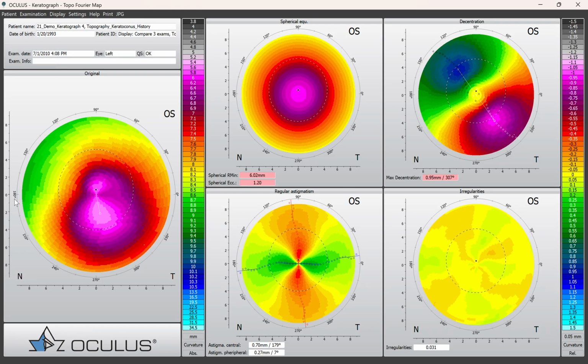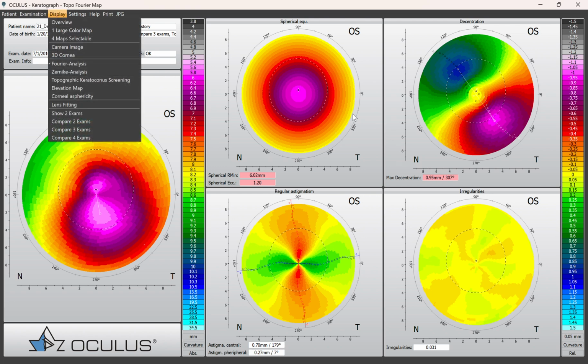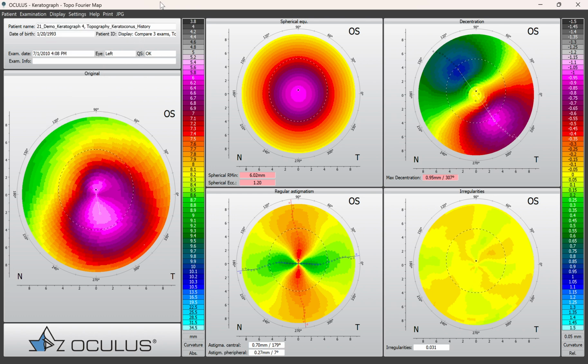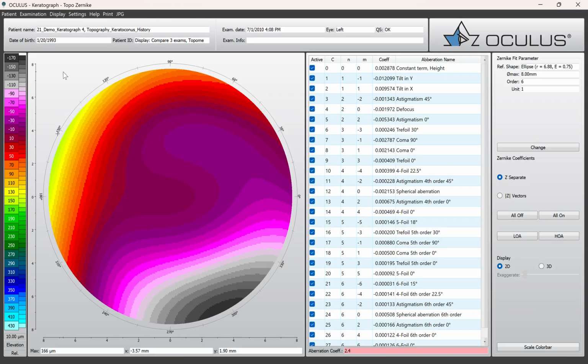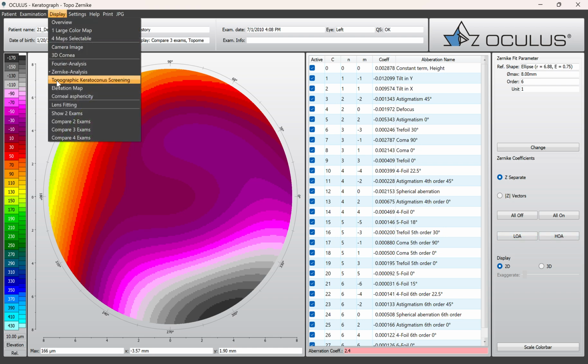Fourier analysis is a mathematical deconstruction of the eye. Spherical, prism, regular astigmatism, and any color left here is residual. That's things that these 3 boxes I can correct with regular glasses, regular astigmatism. Here I have to do something with the cornea, modify the cornea in order to account for that irregularity to fix the vision performance. Zernike analysis, you have different ways so you can look at the data there.